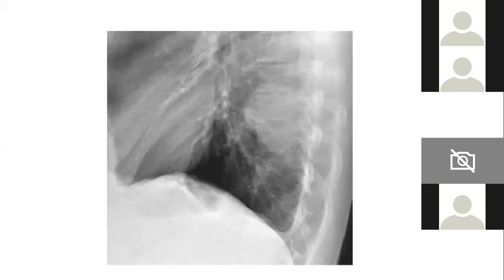So where is the mass? Okay, so this was the mass lesion, right? Usually when you look at a lateral X-ray, there should be increasing vertebral lucencies as we go from superior to inferior. Here there is a slight opacity which corresponded to that particular lesion.